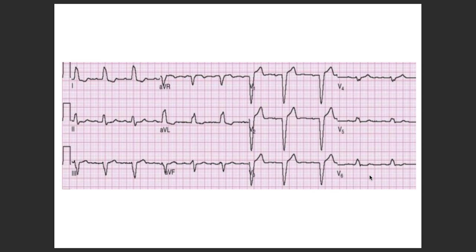Okay, so now we are aware. This is a sinus rhythm, left bundle branch block. Normal axis is there, in fact, as well. There are some subtle changes as well. I don't want to confuse you guys right now at least. Okay, so you know what is called as the intraventricular conduction defects and all. I'm just trying to introduce these topics to you so that it will be there in your mind, and whenever you're trying to read more and more, if you come across, you'll be able to understand.